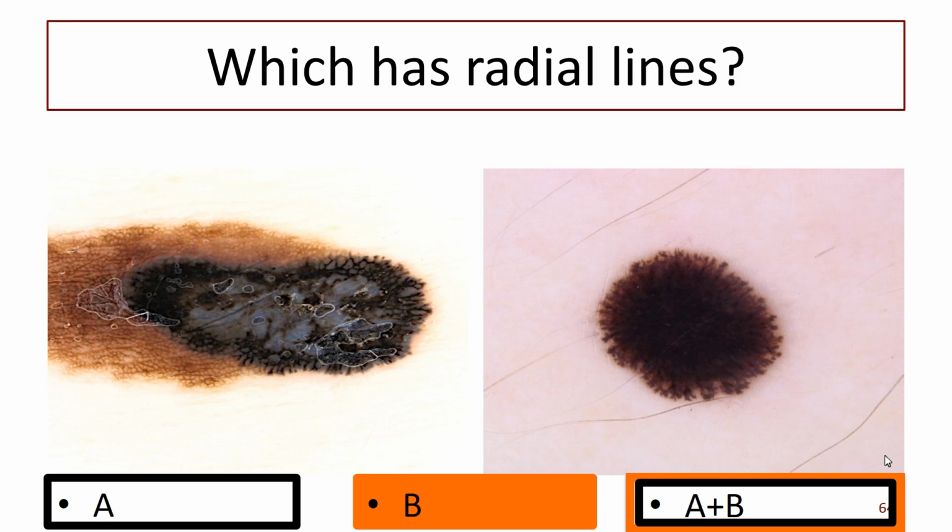What about the background? Yes, we've got a reticular nevus. So we've got something with a radial pattern that's fallen on top of it. It could either be a coincidence that a melanoma has coincided with a reticular nevus, or that the reticular nevus has grown a melanoma. Both possibilities are true, though I don't know about this one, but the research has shown that melanomas can just land on nevi, or they can arise from nevi. And we know that from oncogenetics.